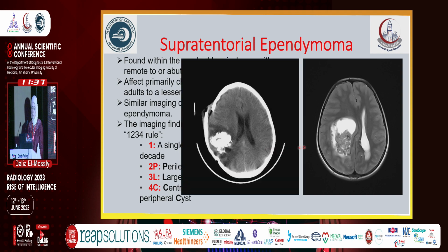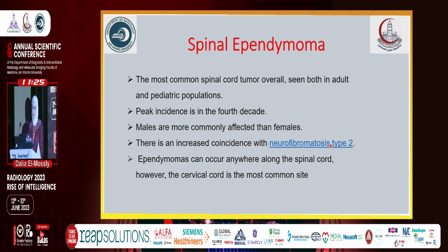As we see here, there is a large mass lesion abutting the right lateral ventricle, solid component, peripheral cyst area, as well as a large chunky calcification.